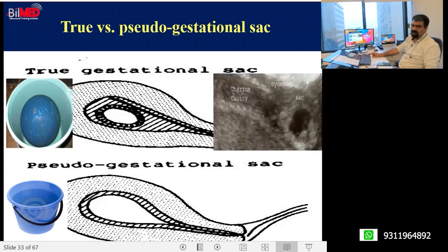So this is the point. Now, how does this look on ultrasound? This bucket, now see, this is the bucket over here. This bucket is having a water ball. This is an unobliterated uterine cavity. So if I am seeing this unobliterated uterine cavity over here, it means I am seeing the space in between this bucket and the water ball. This is unobliterated uterine cavity.